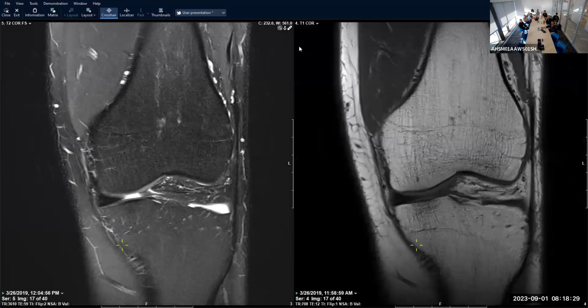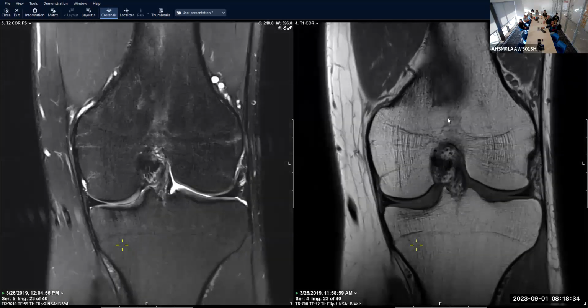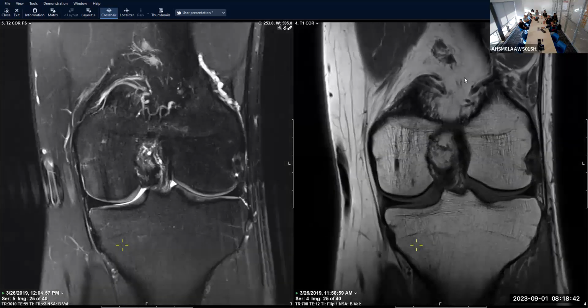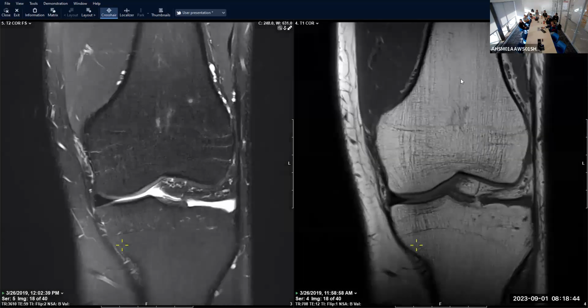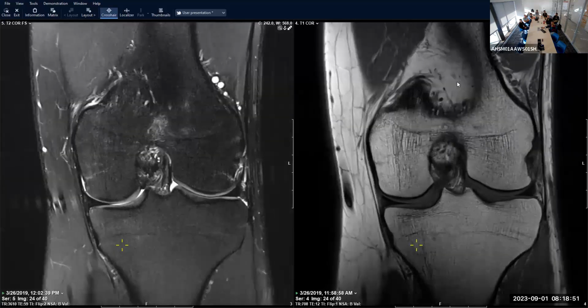The one coronal plane that we have is the T1, so this is the best for evaluation of bone marrow, or if you think your patient has a lipoma or something like that, you're going to be looking at subcutaneous fat or looking for a marrow replacing lesion. In your pediatric population, you're going to see a lot of non-ossifying fibromas, or even in young adults, which are not concerning neoplasms.